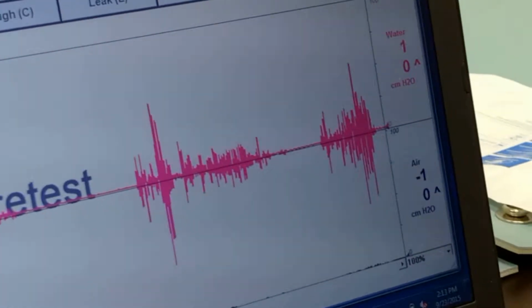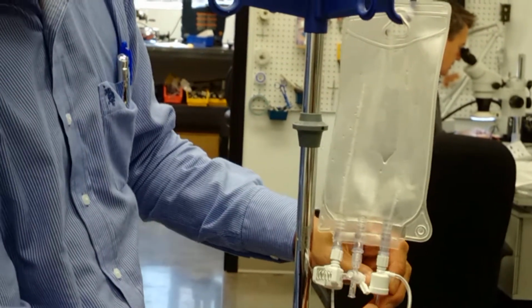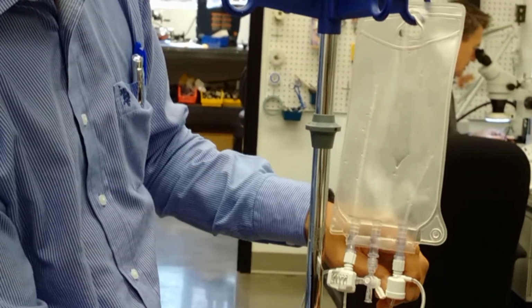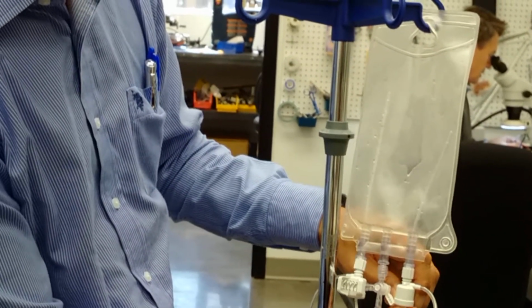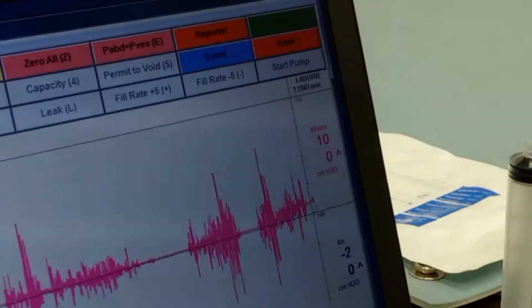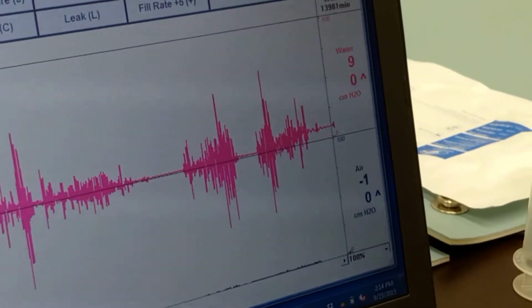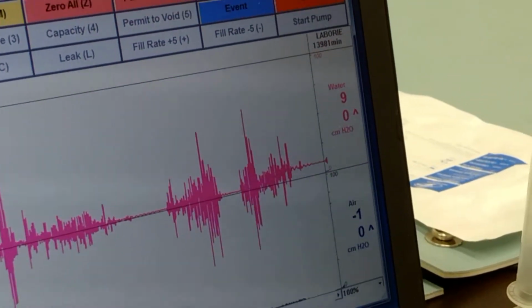And you will see pressure never changed down at the bottom. Okay, I'm going to take the water, I'm going to raise it about the same distance up into the rectum. Kind of hard to notice the trend, but if you believe me, it's actually much higher. It's 10 centimeters higher than before.